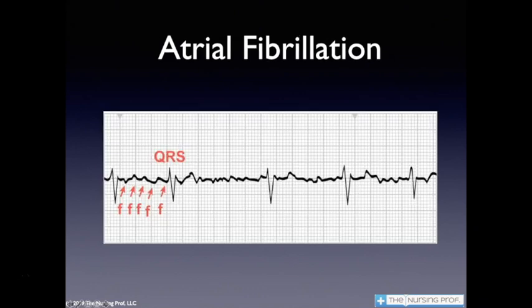This is a picture here of a patient who may have atrial fibrillation. Again, we start out with the ventricular response. We notice the ventricular rate in this case is about 50, so 5 complexes times 10. When we're looking for the P wave, there's nothing there that really looks like a P wave all the way through. If you look at the third complex, you may say that kind of looks like a P wave right before that QRS complex. But do you see the same thing anywhere else? No, they're not the same. Instead, what we're seeing is lots of little waves, which are called the lowercase f waves, the fibrillation waves, in front of each QRS complex.